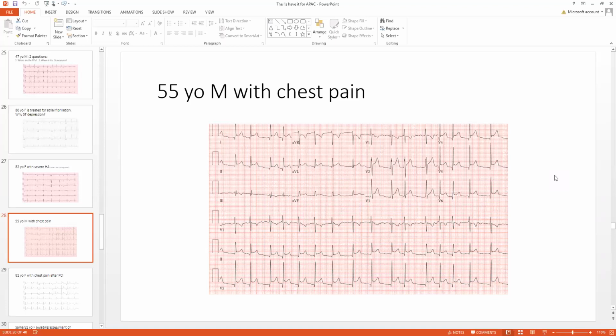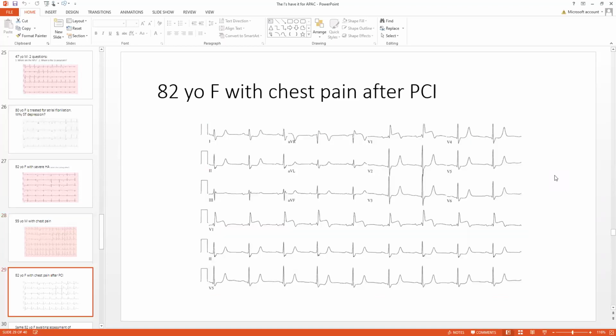So here's my second bad sound. The normal or usual three-component pericardial rub sounds like it's regular because there's sinus rhythm and there are three components. But this patient will have an irregular two-component rub. It'll sound like... your stethoscope will help you read this EKG and diagnose the patient.